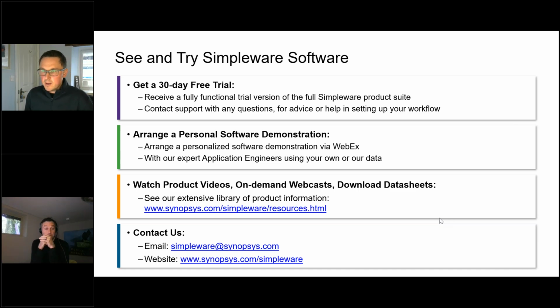So they don't have to be a set slice spacing. It can be any range. Obviously, if you're looking at a lower resolution, 0.5 millimeters perhaps, with the incoming data, then that's what you try and build the data off, and maybe throw in a few extras just for the variety. But it's capturing what you would be expecting.